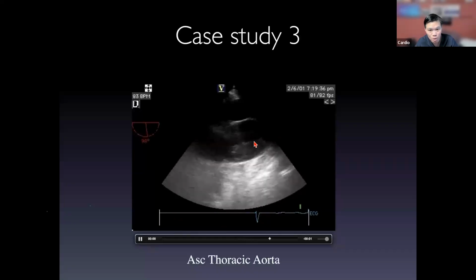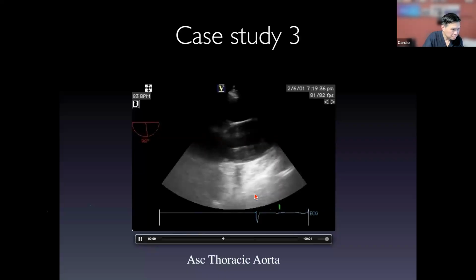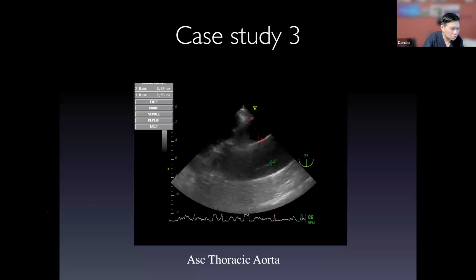Yes, someone says M mode will help. Definitely, very smart. You have maybe seen this lecture before, but it's very good. So one strategy is to put an M mode here, and I think what you're trying to say is you can see the motion, whether it goes up and down together. Another interesting observation is that the distance between the proximal chest wall structure and the proximal ascending aortic wall, and to this artifact, is exactly the same.